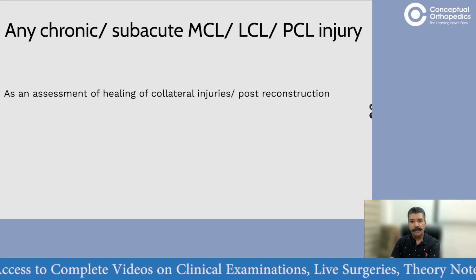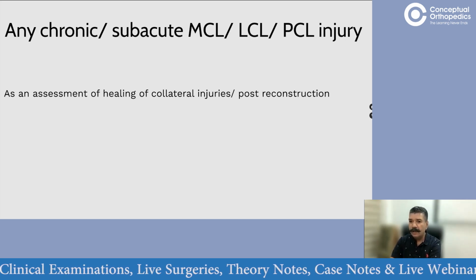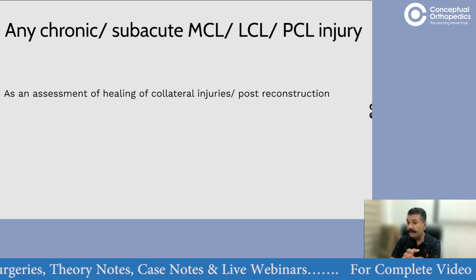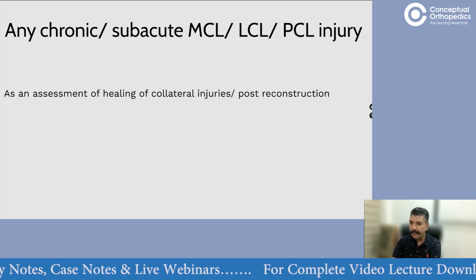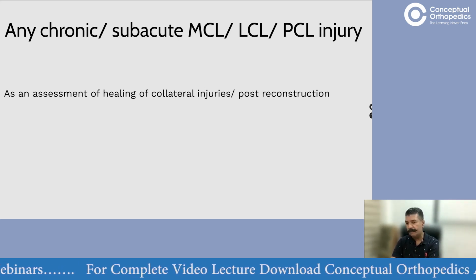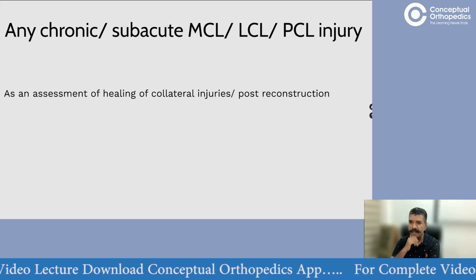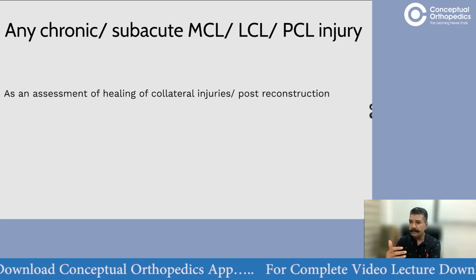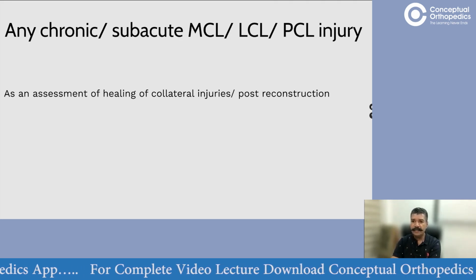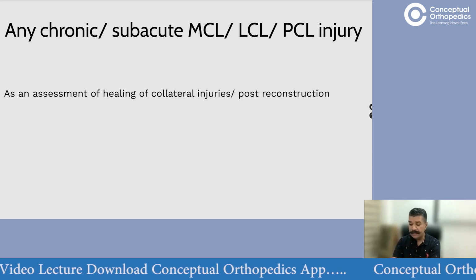Now, when you have a medial collateral ligament injury, in order to give a high-performing individual the certificate or the green tick that you can, yes, go ahead and participate in your sport, you must be very sure that the ligament has healed fully in its original length. And this stress X-ray is a very useful method to help you diagnose that. I also use it to follow reconstructed ligaments. So after a PCL reconstruction, or after an MCL or an LCL reconstruction, it is useful. It is not a very practical thing to do for ACL reconstruction, where you can very well judge things clinically. And it's very useful in all these other scenarios.